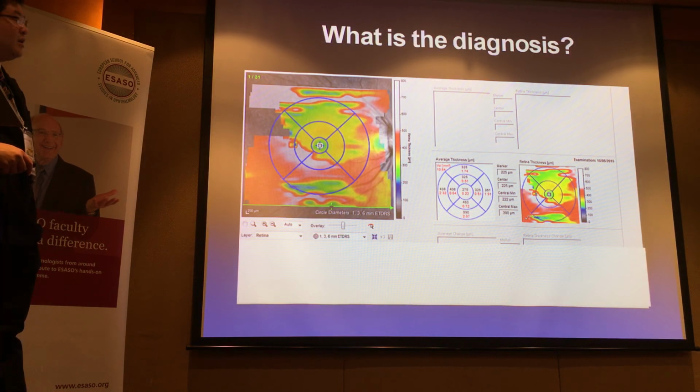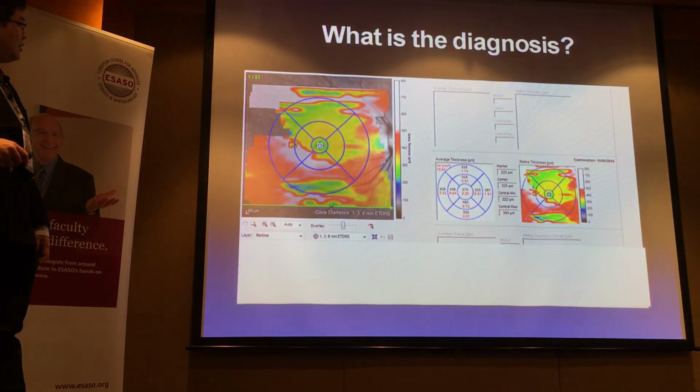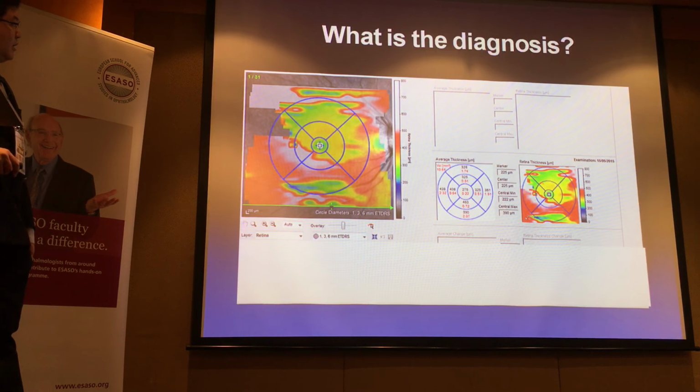The algorithm the machine will use will be the same, right? But how could these two things, the color map and the thickness map, show the reason behind the two different things, because the machine is using the same algorithm? One becomes normal, so you can imagine, okay, this patient should be normal. The other is showing something very haywire. Right. So I think so.